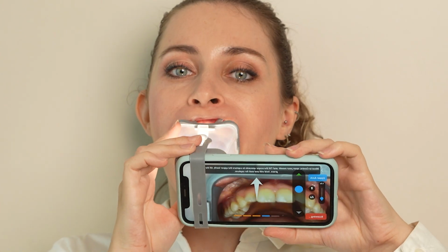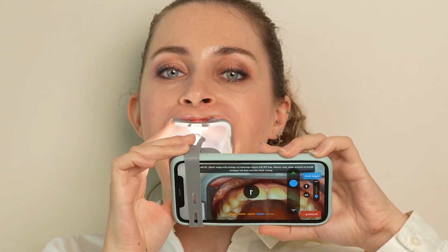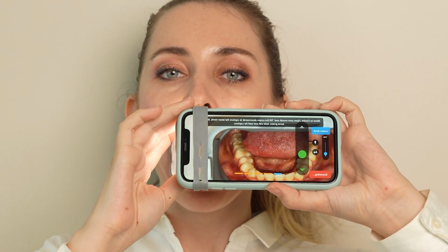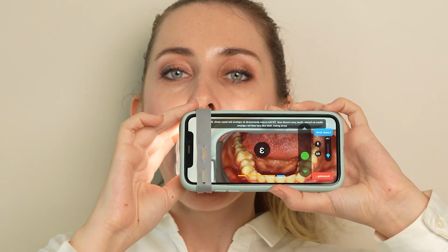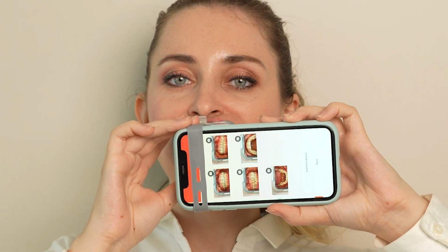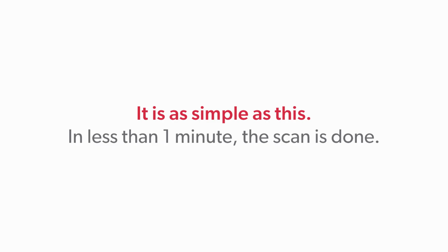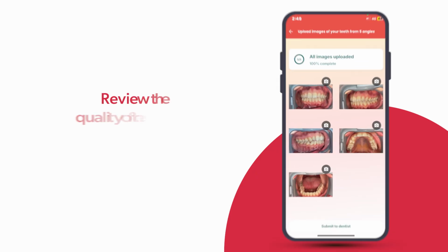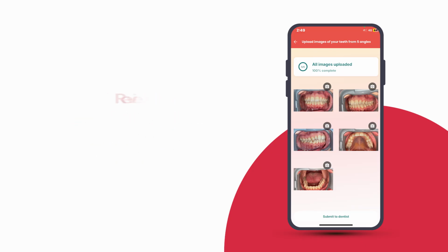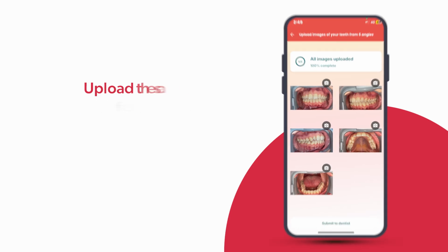For the upper arch, open your mouth slightly and tilt up. For the lower arch, open your mouth slightly and tilt down. It is as simple as this. In less than 1 minute, the scan is done. Review the quality of the captures. Once confirmed, tap Submit to Dentist to upload the scan for clinical analysis.